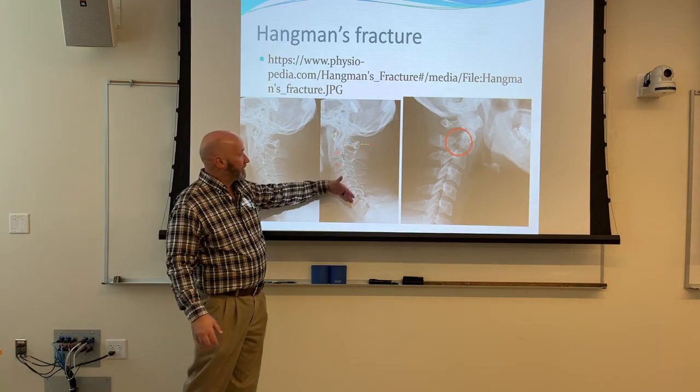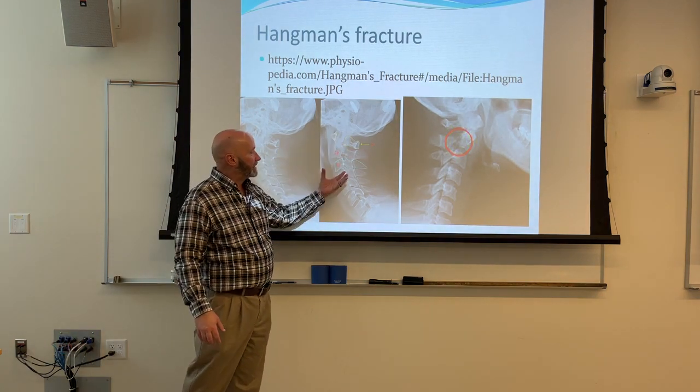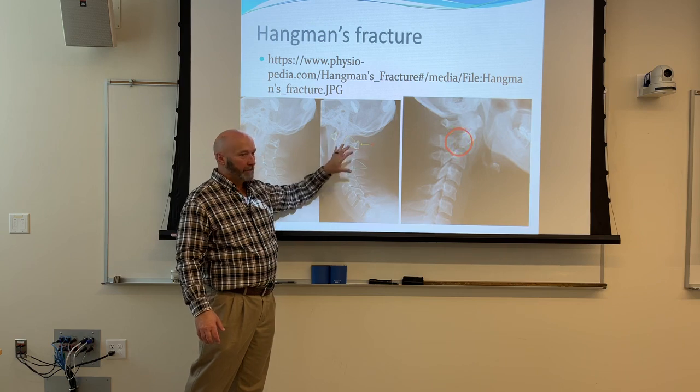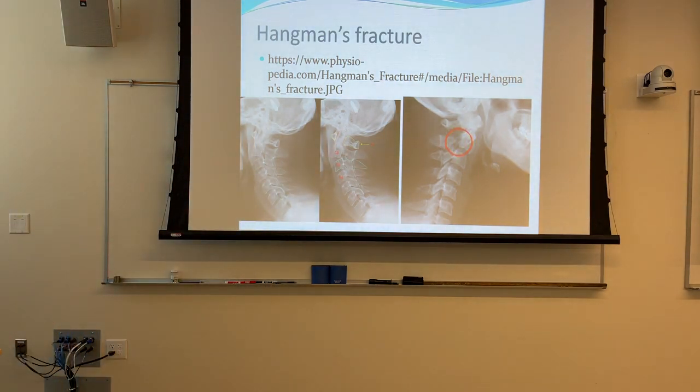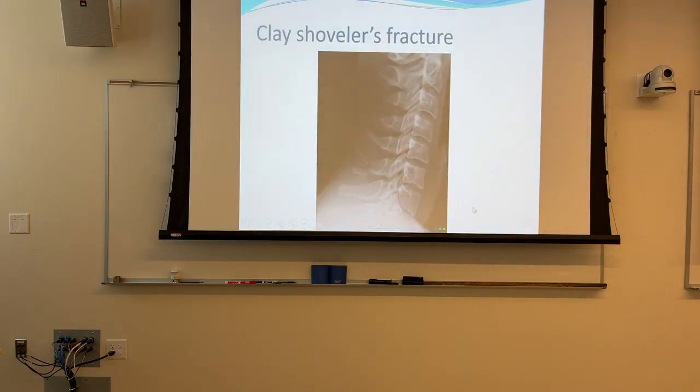So hopefully, in a situation like this, that may be what that is, to pull traction on the patient's head so they can reduce that dislocation. Ugly. And they may be in that situation for several days.